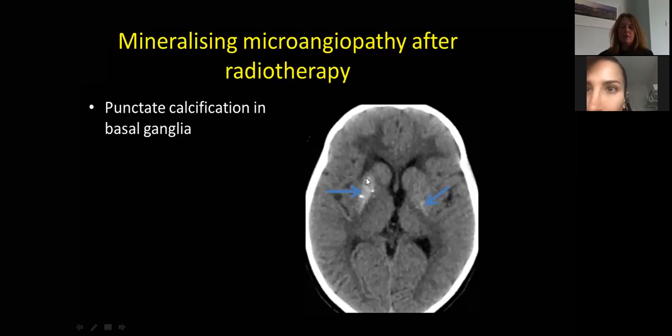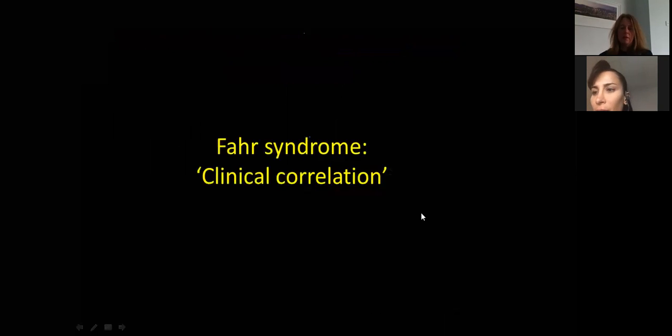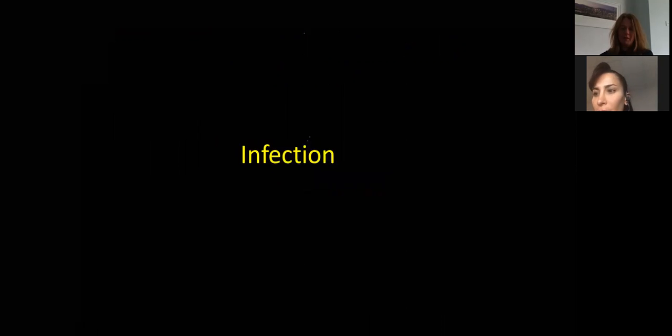Now, the fact that it's bilateral should also make you think that it could be an endocrine or metabolic thing. So it's not really focal. If this person came in to Stepping Hill and was referred to you as query oligo, then you could actually find the other side being abnormal. You could suggest, well, it might actually not be a unilateral lesion to be concerned about. So you'll probably see in our reports for these, clinical correlation advised.